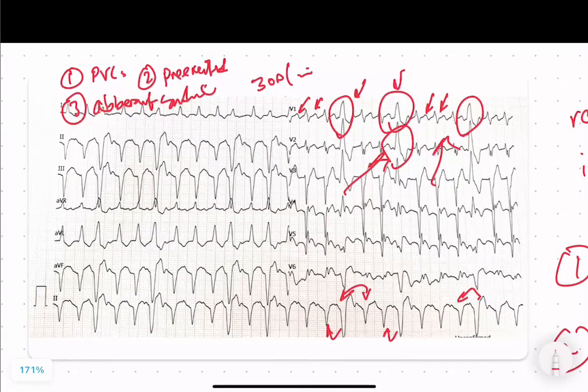In summary, this ECG was a flutter with PVCs in between. This case teaches us the art of careful observation and the significance of looking at the baseline ECG. It reminds us that behind every rhythm anomaly lies a story waiting to be decoded, enriching our knowledge of ECG interpretation. And there you have it.